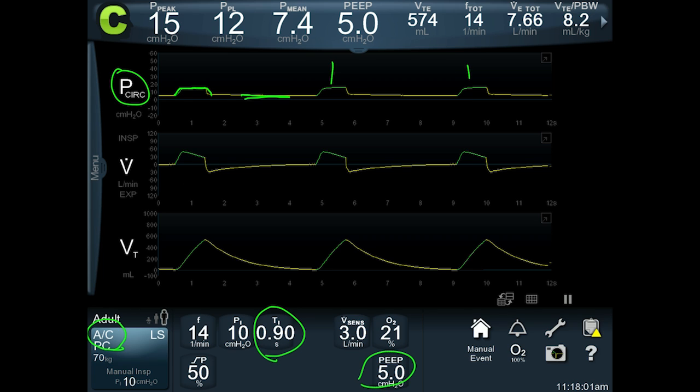And contrast that to the volume or the flow waveform. What you see here is a waveform that is not square like you saw with the volume control mode. It's a more gradual increase and a flattening out, gradual increase and flattening out or decreasing a little bit throughout the life of the breath itself. And then again, it is the same here every single time. Now this, we're assuming that the patient is paralyzed and not giving any efforts whatsoever.